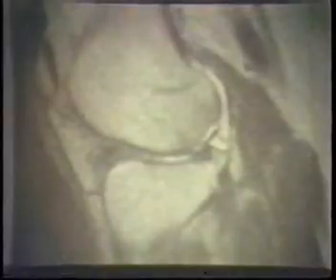One other thing I'd like to show you is a type of osteochondritis dissecans. I'm showing this because in osteochondritis dissecans and other fractures, what the orthopedist wants to know is how to approach it. If the articular cartilage is intact, he does not want to approach it via the joint space by arthroscopy. If the articular cartilage is not intact, then he wants to go in and debride it so that there are no loose fragments which will produce degenerative changes.